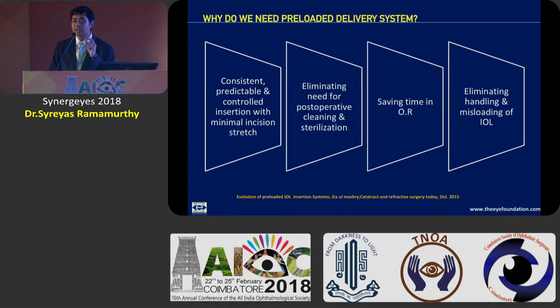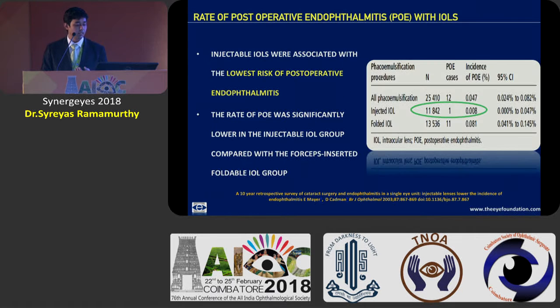Additionally, the amount of handling of the intraocular lens while it is being loaded is greatly reduced. So therefore, there is a greater degree of sterilization available to us. Importantly, whether we load the lens or an OT assistant loads the lens for us, it is quite possible that there is a greater tendency for these haptics to get caught in the plunger. Occasionally, all of us have faced the situation of the haptic breaking, and it's quite irritating after that to be cutting the IOL, enlarging the incision, removing the IOL, and placing another IOL. All these can be completely done away with a preloaded IOL system.